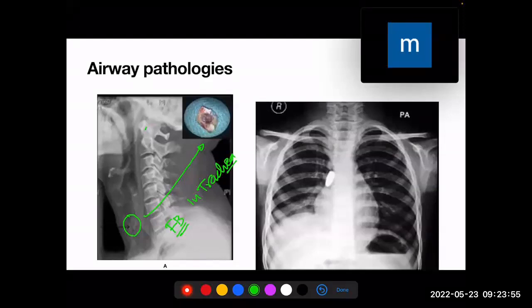So that is it. What about picture B? This other picture? Anybody? Let's follow together. We start with A. We look at the trachea. There is supposed to be tracheal bifurcation down there. Looking at the ribs, looking at the heart, essentially looks normal. It is sitting over here.